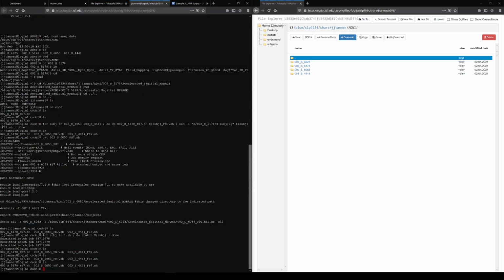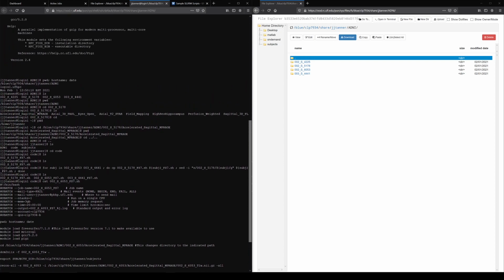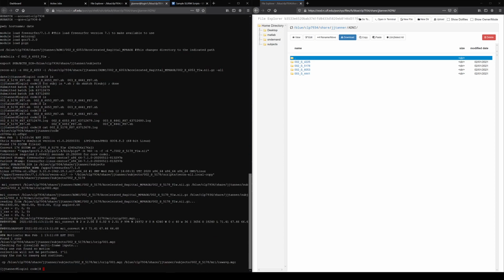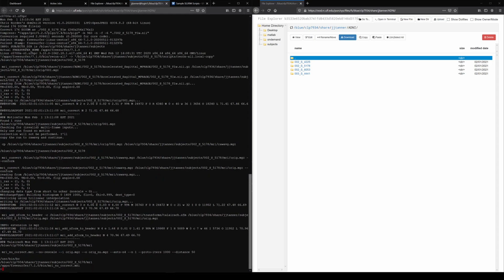Again, we can also come back and I could look to see, okay, now there's a log file for each one. So I could cat this first log file just to see what's in it. Oops. And it's going, so right here. You have to be careful with this because it can do a lot. I mean, this file can get very long. Another way to do it is a command called less on the log file. And then it'll just show you to the end of the screen.